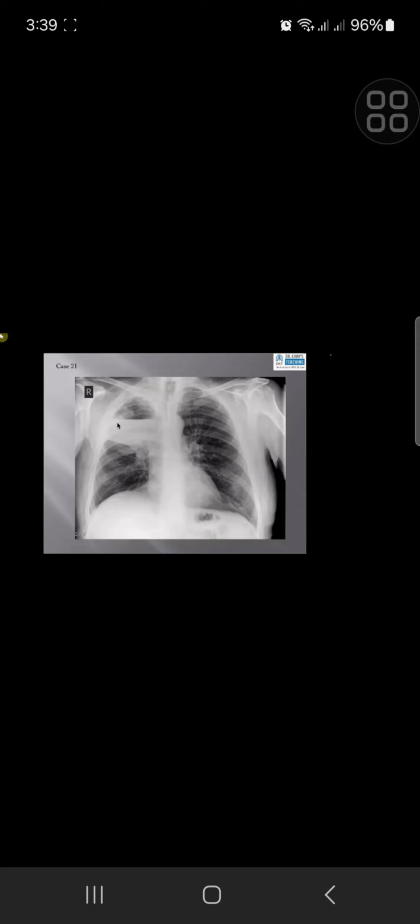What would you call it? It could be encysted empyema. Okay, that's the pathological abnormality that causes the condition. But what is the imaging description for an air fluid level in the pleural space? Incomplete border sign, when we see something suggesting that it is.